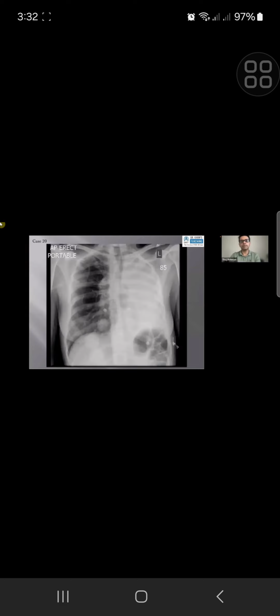So increased density with shift towards the same side: think of collapse. Think of mesothelioma. Lymphangitis is a completely different picture. Chapman gives this differential, but that's a completely different picture. And pneumonectomy, I'll show you a case of pneumonectomy, but then the whole chest will be opaque. And the other differentials that you know already.